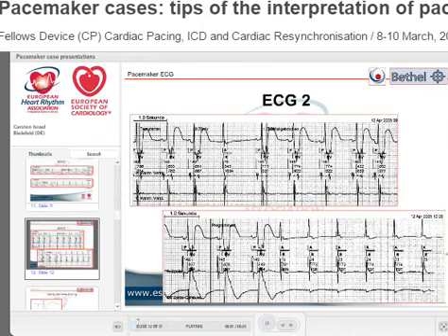And that is why all modern pacemakers have a ventricular safety pacing feature, and that is nominally on in almost all devices, which is a good idea, by the way. This is not so nice, but again, there's atrial pacing. It could be that in some old leads, some of the current is still visible at the end of a safety window in the ventricle.